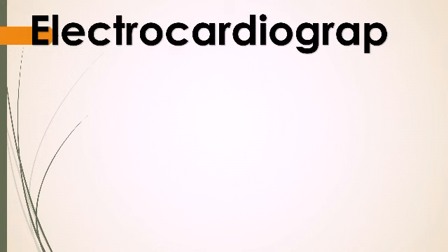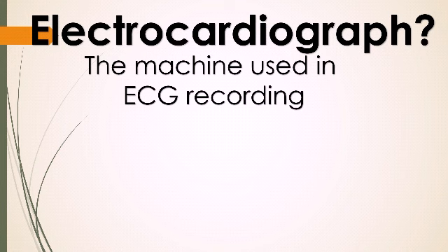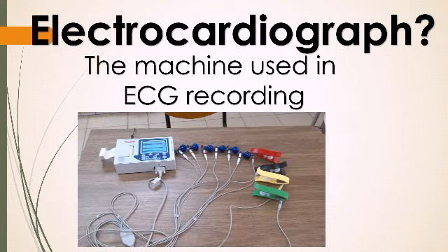The first one is electrocardiograph. You wonder, what is electrocardiograph? Actually, it is the machine used in ECG recording. So it is a machine like this one. This is electrocardiograph.